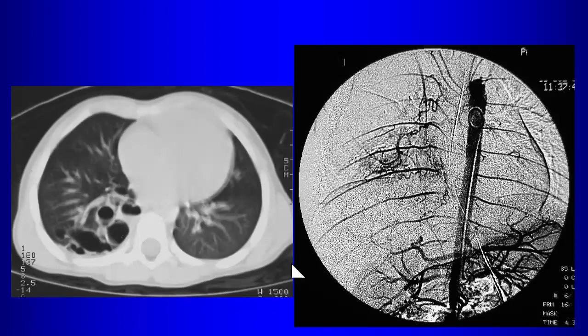Do you see where the lesion is on the angio? Well, is it going to be on the right or the left? Right. What side is the right? Be on this side. Okay. So you see all these vessels here, right? All of that stuff, that's over here. So what vessels are supplying this?